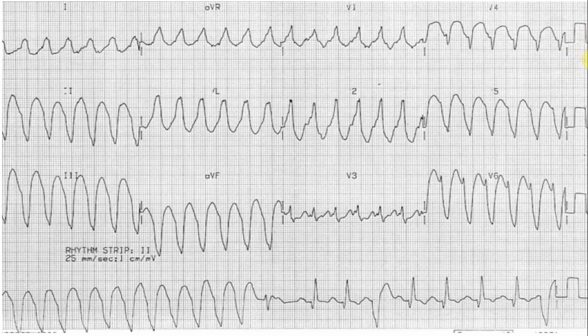This is another fabulous ECG, Avijith. Thank you. I am going to interpret this ECG in a very systematic way so that I do not miss the important findings. Excellent. The elephant in the room in this ECG is a wide complex tachycardia. I will come back to it in a second. Let me talk you through the usual stuff at first.